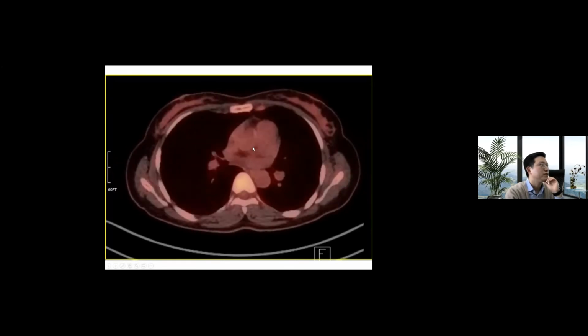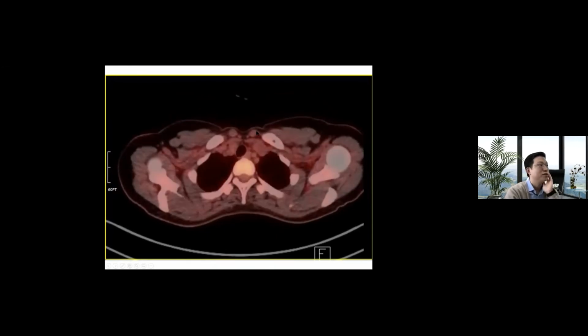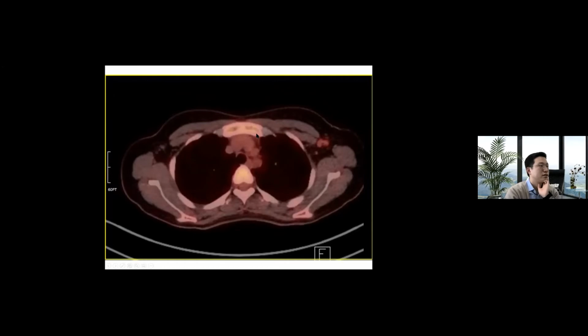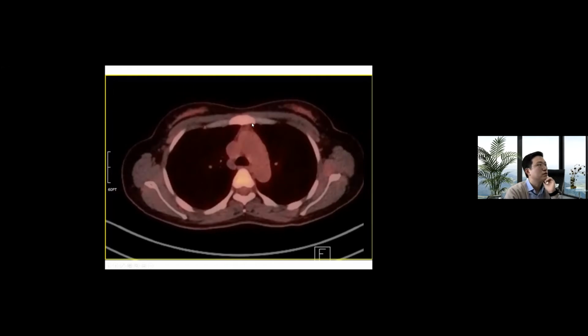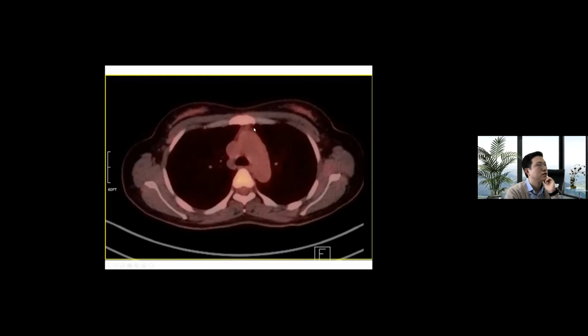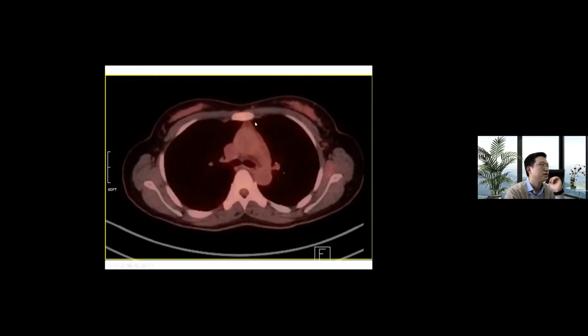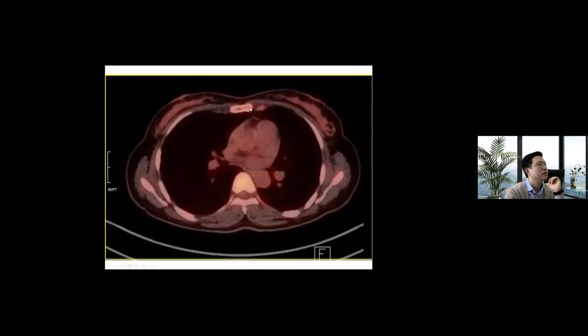And then we have to look at the internal mammary area because internal mammary lymph node metastasis changes the N staging. So look carefully in the parasternal area as it goes down. And you can see an enlarged lymph node here. It's not seen on the right side, but it's definitely an enlarged lymph node with slightly increased FDG uptake.